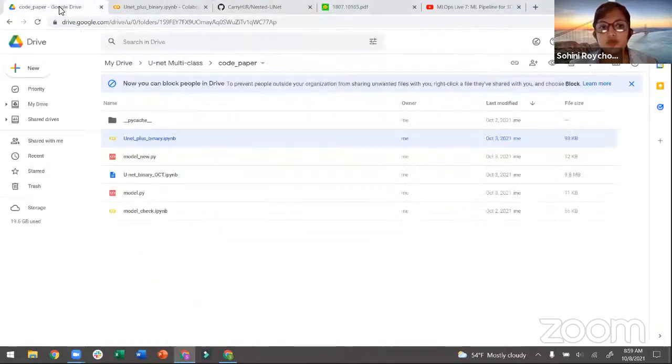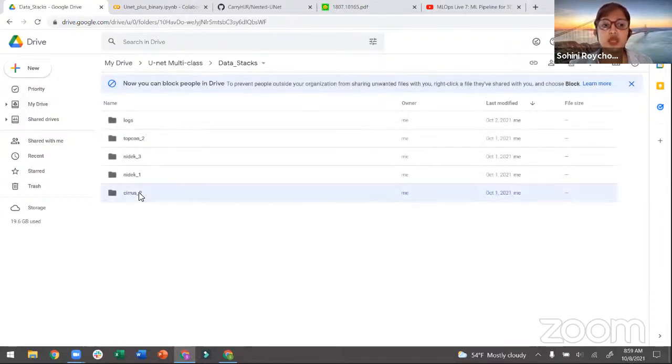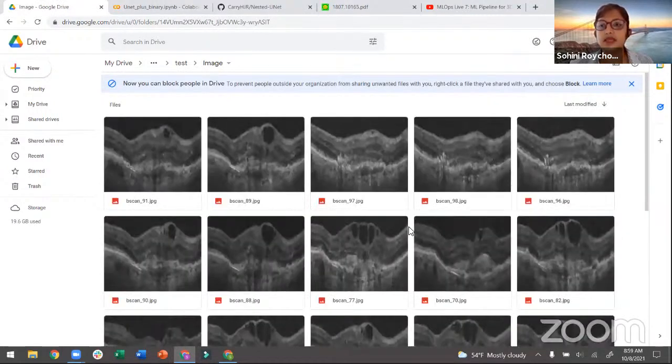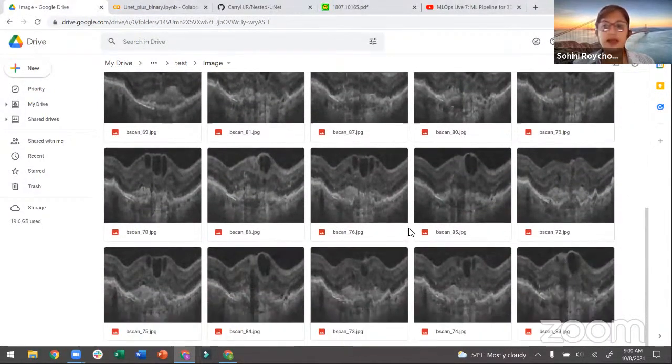One of my most popular videos so far has been on Unet, so that's the reason why I decided to extend that particular work. I wanted to show you that today I will be working off of an OCT image stack, and the OCT image stack actually looks like this. Let me make the images bigger. So these are what the OCT images look like. And if you see, all of these images are acquired for the same patient. So these are 3D, the third dimension of the retinal image for human eyes, and they are telling you what is the thickness of every single retinal layer is.